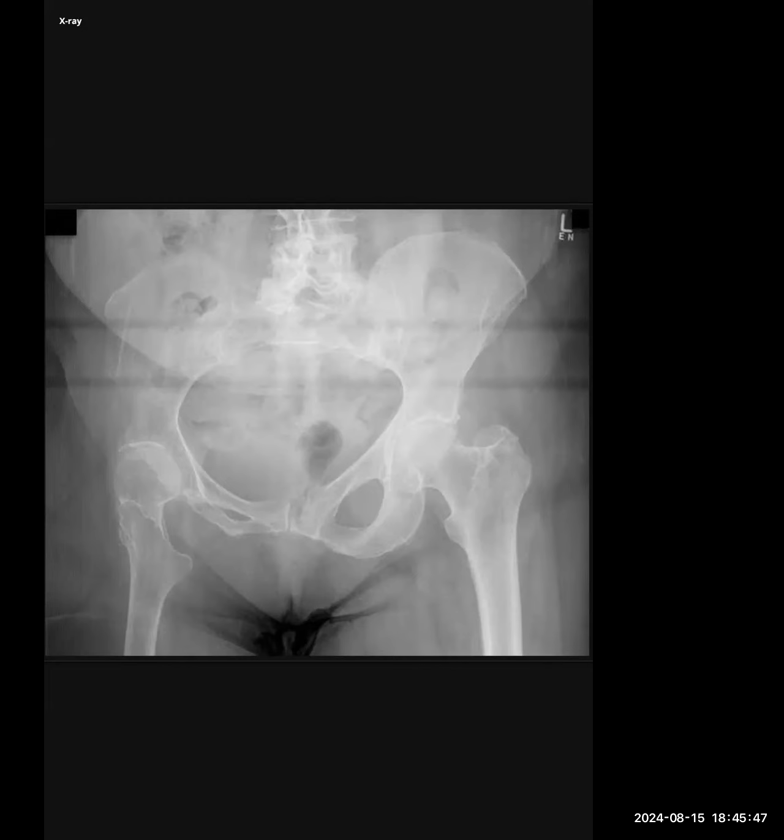along the facet joint of the L5 and S1 vertebrae. Even the muscle bulk on this side appears reduced. So the possibilities in this case would be that of a neuromuscular disorder affecting this side, like poliomyelitis or some hereditary neuromuscular disorder with the secondary attenuation of the bones.